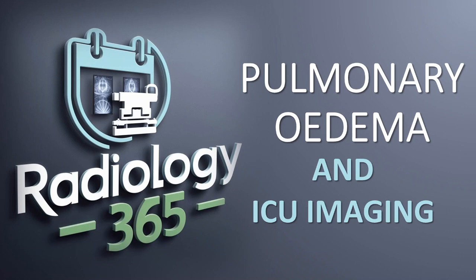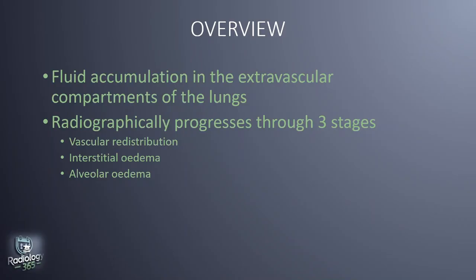Today we are going to be talking about pulmonary edema, and then we'll add some tubes that we see on chest radiograph in an ICU patient. So pulmonary edema is actually just the accumulation of fluid in the extravascular compartment of the lungs.